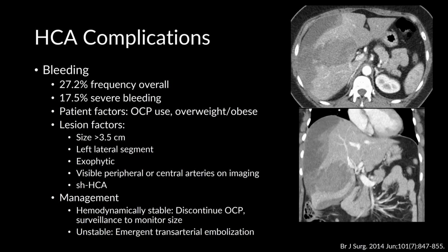Patient factors that increase the risk for bleeding include OCP use, as well as being overweight or obese. Lesional factors are lesions that are greater than 3.5 centimeters, located in the left lateral segment, are exophytic, or we can see the vessels on imaging going through the lesion or around the lesion. And then again, the sonic hedgehog subtype has increased risk for bleeding.